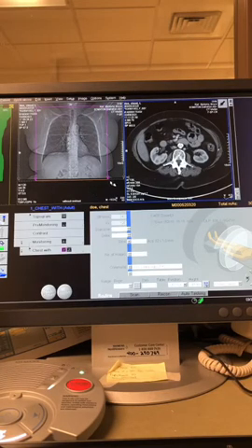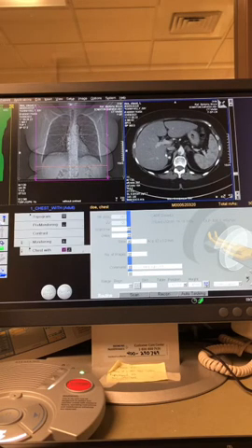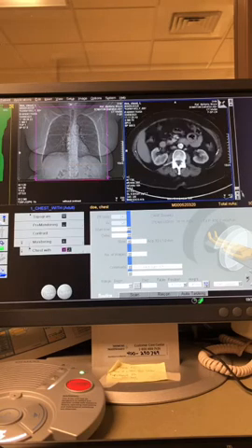Maybe pull that down some, and then this one down here, I'm really only trying to get through the mid kidneys. We can see the full liver here, so we've got most of this kidney, and the left kidney is typically higher, so I would more likely be at L1 as opposed to L4 down here. So they really did over scan on this patient. Well, here's mid kidney. You want through the adrenals for most protocols, and the adrenal glands are like this upside down Y here. So maybe they did go far enough.